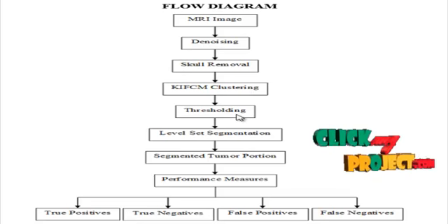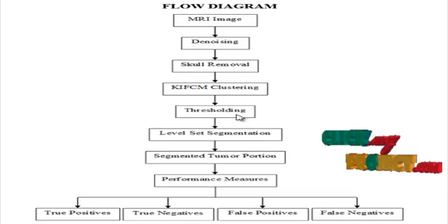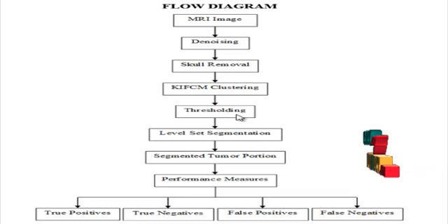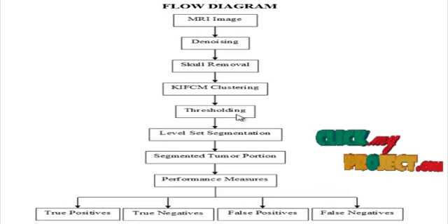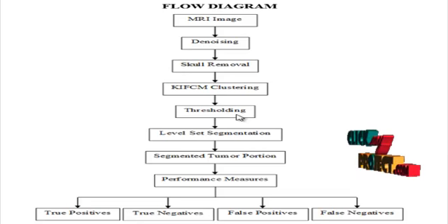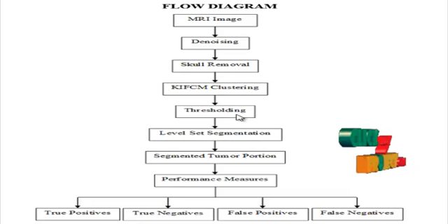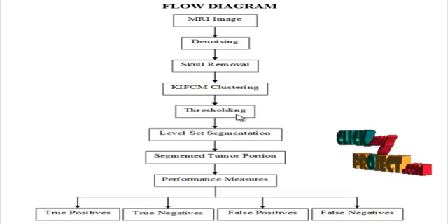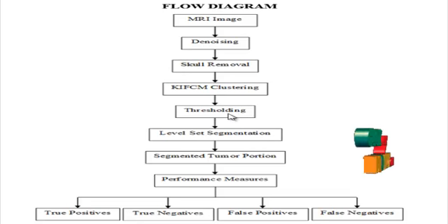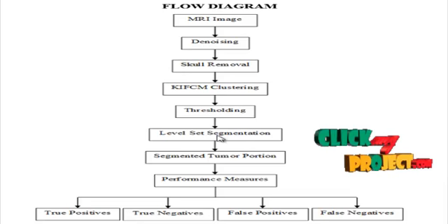The specific threshold for the brain tumor portion is identified based on the maximum pixel of the input image. The image pixels having maximum intensity were identified to be the tumor portions. The threshold value is adjusted to be 30 pixels lower than the maximum pixel. The image pixels greater than the threshold value were assigned label 1 and the others were given label 0. The pixels having the value 1 are the tumor portion and the other regions are the normal image portions. The obtained threshold regions are then used for the level set segmentation process.